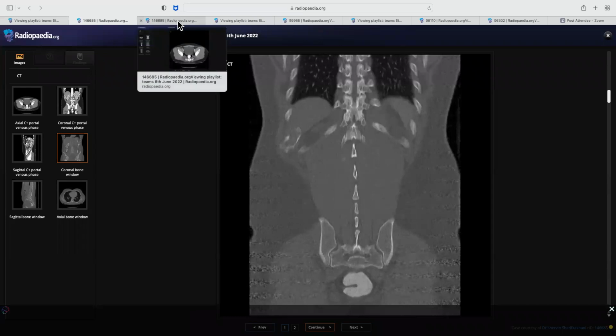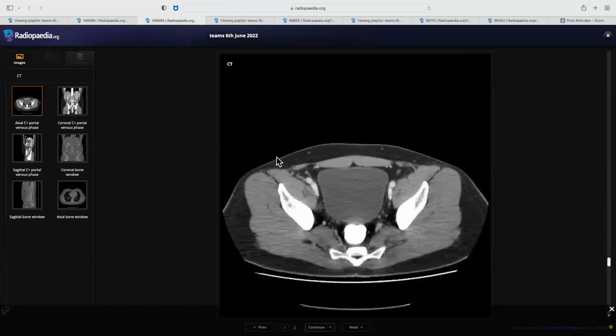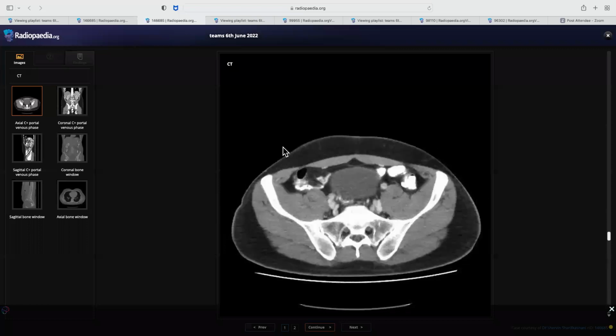Okay. We'll go to the next case. Just a minute. This one you have done, right? Okay. No. Next, yeah, is this.